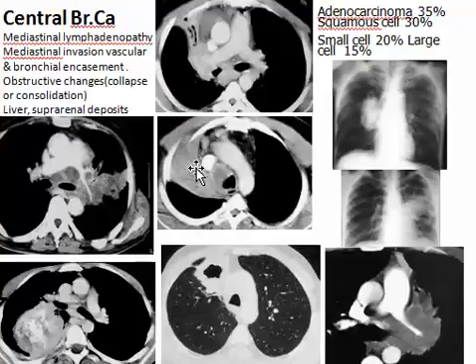In this one, there is vascular encasement, tracheal encasement, and there is consolidation. Here there is mass, lymph nodes, and reaching to the periphery with mediastinal invasion and vascular encasement. Here we have a cavity with irregular nodular inner margin, and here we have a large mass related to the central area, and it causes encroachment on the esophagus and encroachment on the right main bronchus.